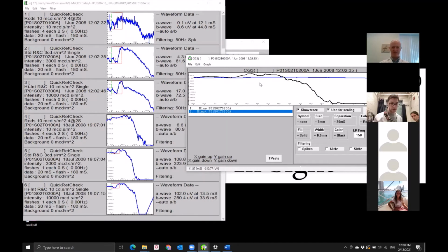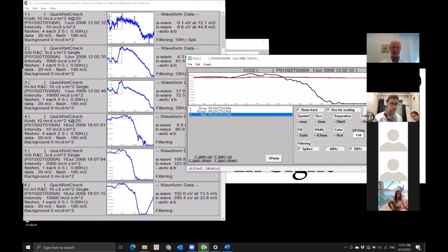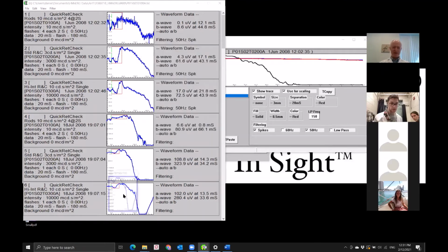Oh, let's see. So that has a very low waveform in there. So let's drag in the B channel. You can see that the signal from that one line is very low compared to the other. So that probably tells me this might actually be more flat than anything. But let's pull up another one and see what happens.